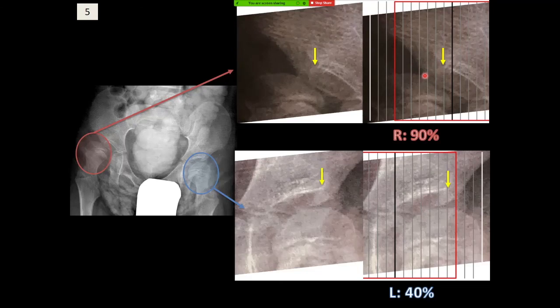Now it's not 90, but that still is a very elevated migration percentage. On the left side, using the bony edge of the acetabulum would put you close to about 30%, which still deserves a referral. So as you can see, the Gothic arch may not really change whether a child gets referred or not, but in some cases it could. And so it's important to be aware of that appearance to the hips.